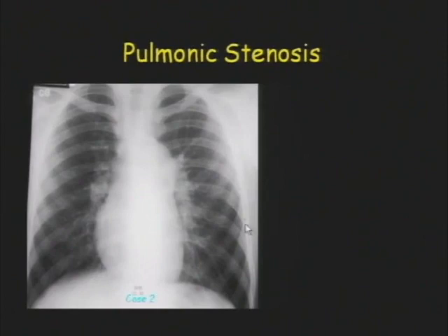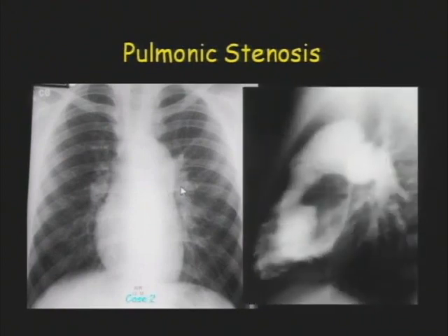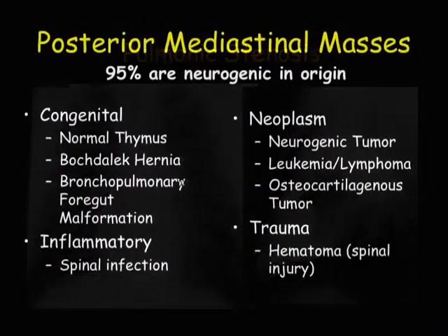One vascular lesion that's pretty common and fairly specific in appearance is pulmonic stenosis. Because of the water jet phenomenon of the blood going through the pulmonic valve, the patient will have enlargement of the main pulmonary artery and the left pulmonary artery, and they'll have a systolic ejection murmur. Here you can see the domed valve, and it'll have a small central hole, and then you can end up seeing the enlarged main pulmonary artery.